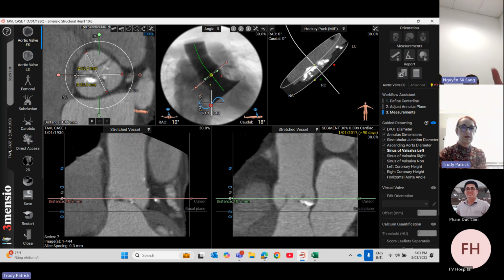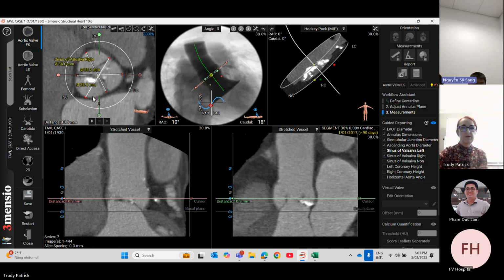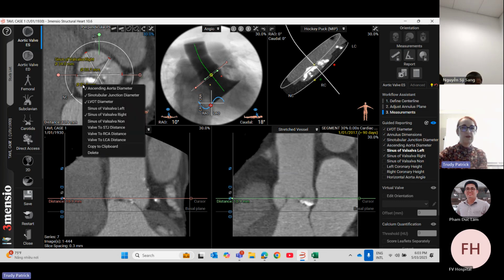Tạo cái đó. Double click. Đúng. That's a moment. Yeah, and we go across this way to here. Okay. So then we're going to... So we're just going to... What's that one? That's the right. Yep. Sai là cái vòng. Yeah, just do the left.